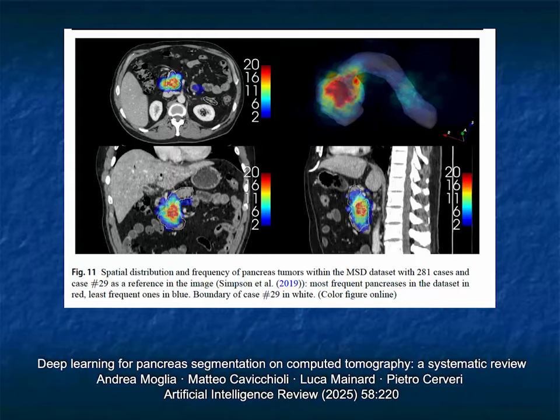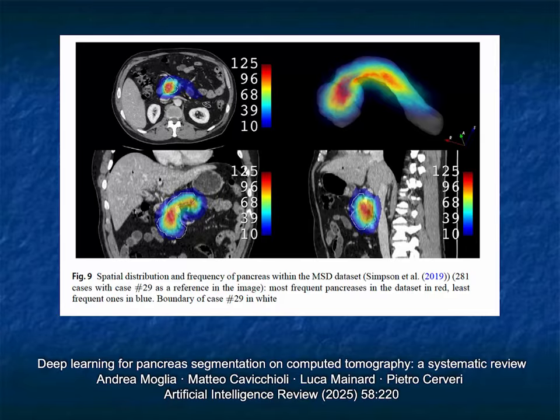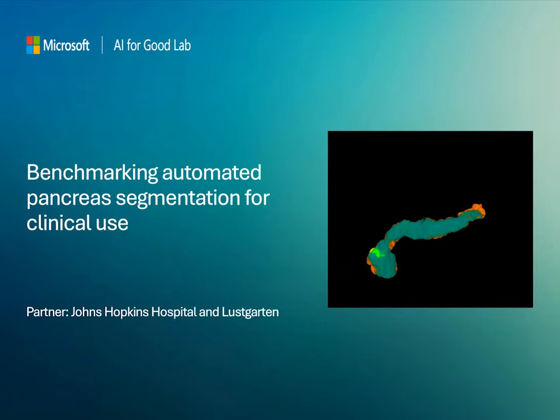They showed some work they did where you can see the pancreas identified. The red is where the patient's pancreatic tumor is. So you can see a reasonable attempt at localizing the gland, localizing the duct, and this becomes very important. You need to do this, and again, you need to be able to do it on the normal cases as well. Radiomics is dependent on accurate data, and so is AI. So we need to do better.